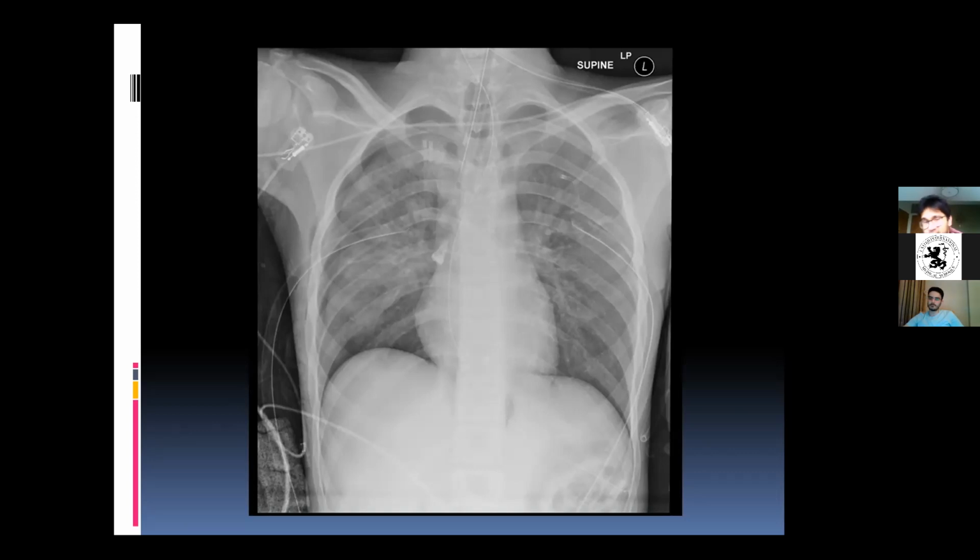And what do you see over here? It's a very obvious anomaly that you can see over here. A tooth, exactly. So this is typically in older people. You won't find this kind of stuff in younger individuals. In younger individuals, you'll probably find coins or things that you can make IKEA furniture with, maybe. But in this case, it's definitely in older people. Okay. So there you go. That's the actual anomaly itself.